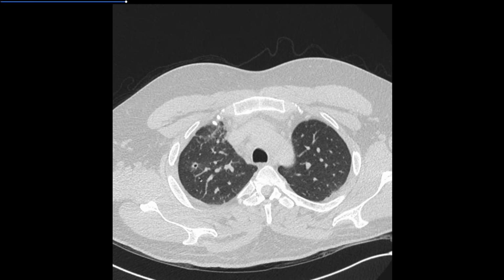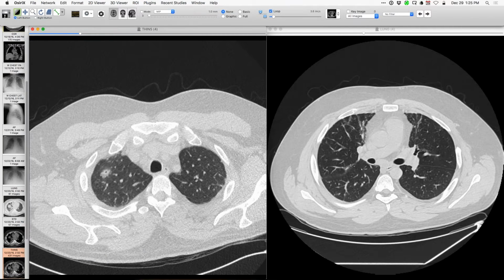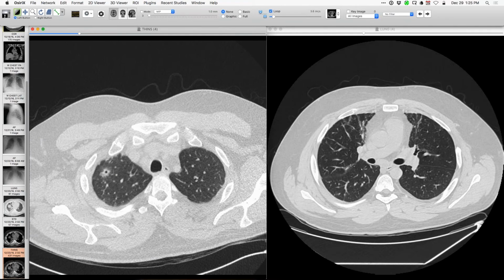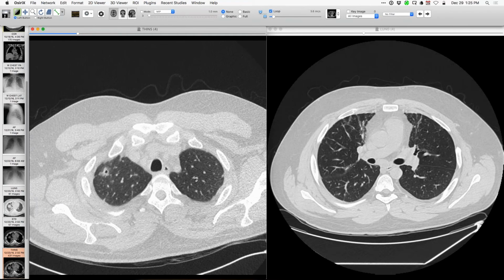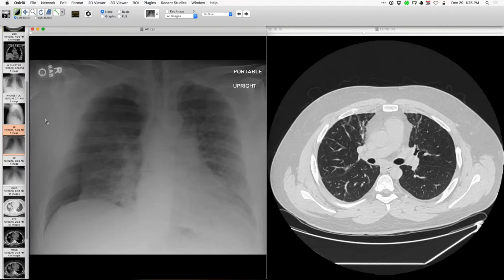Yes, in one of our transplant patients one time, and ours were more ellipsoid, more elongated. That was done by one of our interventional pulmonologists. I find they take a little bit more generous samples. Okay. So there were a bunch of them, and you could follow them almost out of the airways. The other thing is that we've seen a couple of these get near fissures or external pleural surfaces. You can see how you can get a pneumothorax following transbronchial biopsy. And David, that's what happened to this patient, as shown in this radiograph? Yeah, exactly. Got a post-biopsy pneumothorax too. So quite an adventure.